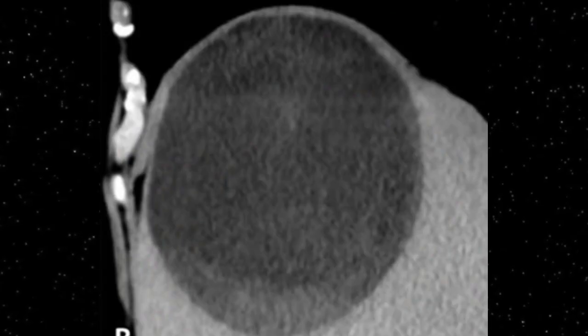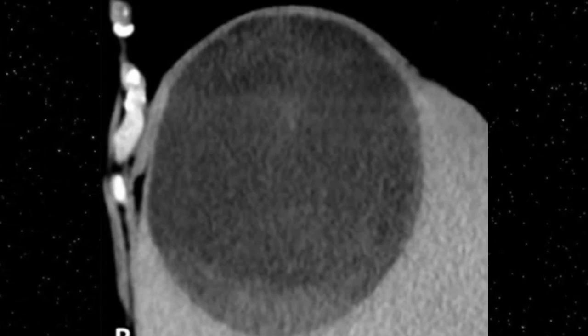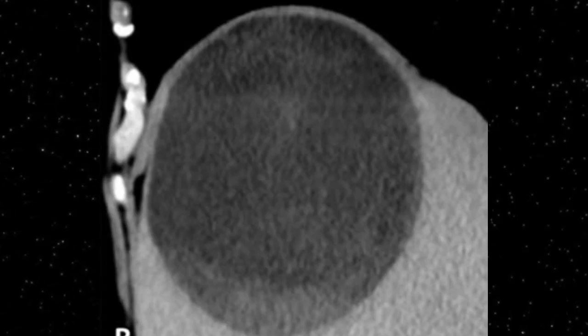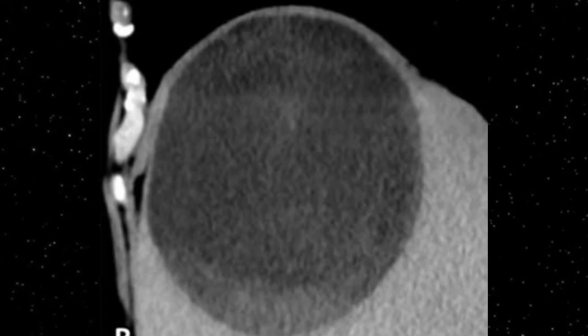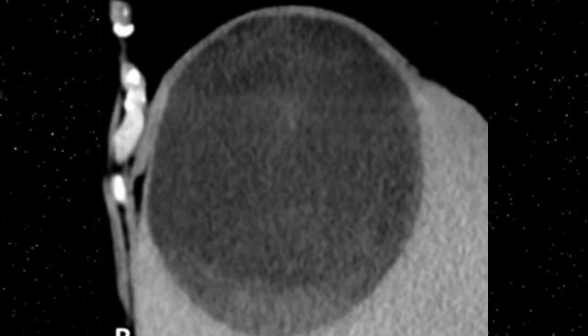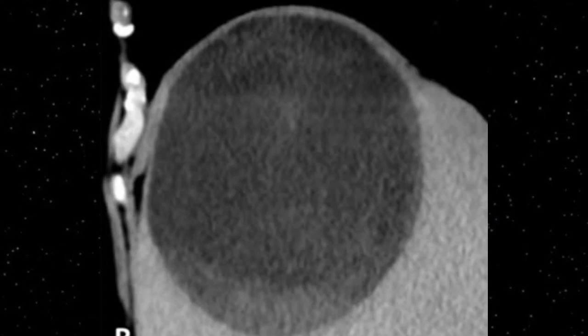And in the third entity, if there is an intramural nodule or thick septation, then a CT scan should be advised. So this was all about the cysts. On this image you can appreciate a well-defined round cystic lesion with low-level internal echoes. When there are low-level internal echoes, this would not be a simple cyst. You will have to call it a complex cyst. Measure the size. Mention it has a smooth boundary and it contains low-level internal echoes. So this is a complex cyst example.